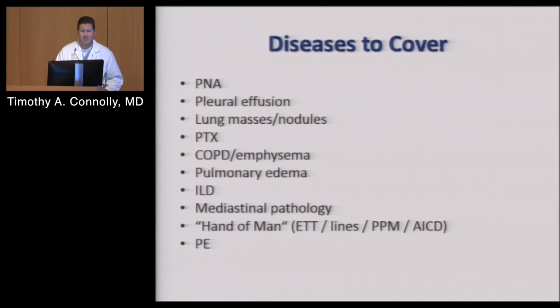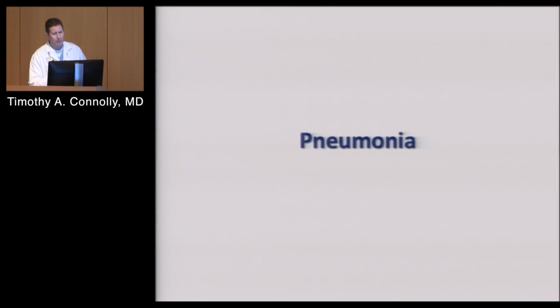So in terms of diseases, again, I'm going to kind of fly through these. We're not trying to go into all the nuances of the clinical management of problem A, B, or C, but I want you to really get a feel for what things look like with the different modes of radiology. And we'll go back through these again with CT scan to get that view and that side of things. So starting off with pneumonia.